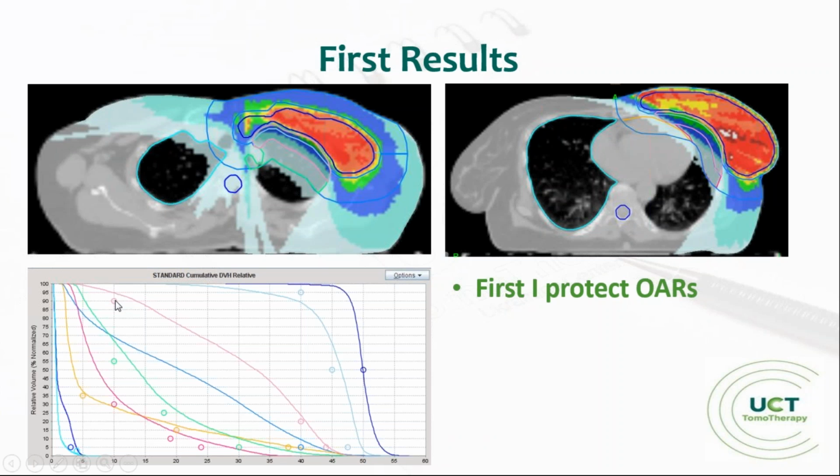We have 3 points on the DVH which we use for calculations. One point I usually put for small doses and large volumes. Another point I usually put for middle dose and somewhere in the middle of the volume.